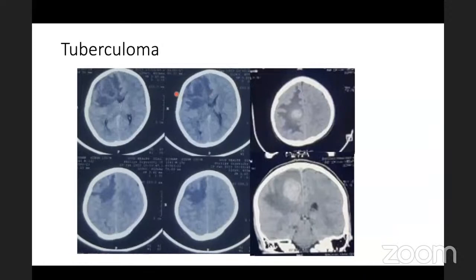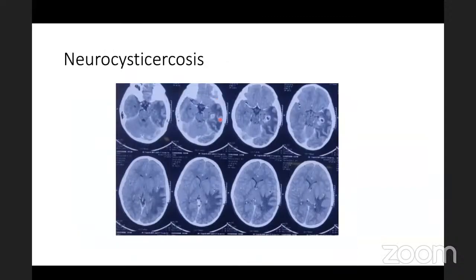Always when a radiologist encounters a tuberculoma, or a clinician encounters a ring enhancing single lesion, he always thinks of another condition called neurocysticercosis. So this is neurocysticercosis, which shows a smaller lesion, lesser edema when compared to the tuberculoma, lesser midline shift. And the most diagnostic point here is the small dot which we see inside the lesion. This is the head of the worm, which is calcified, which is called the scolex.